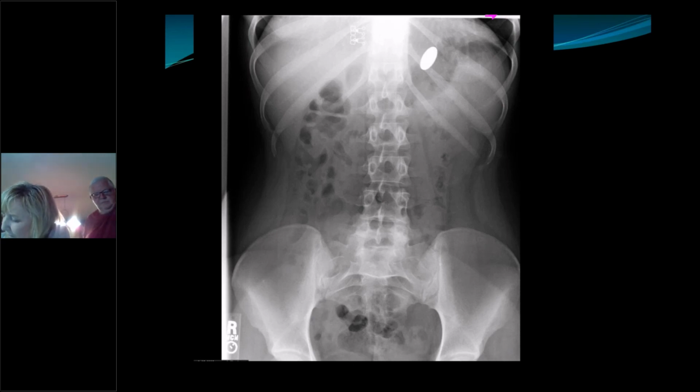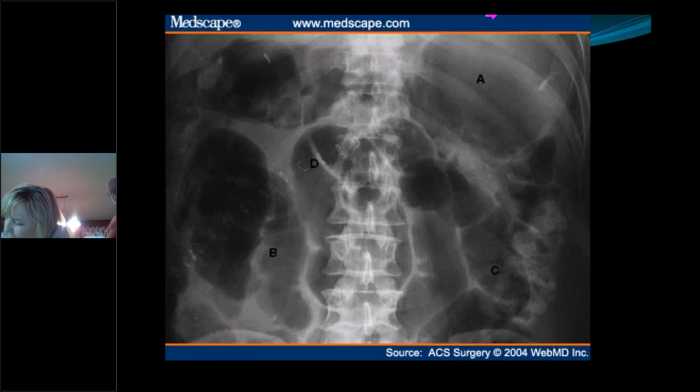This certainly is different if this person had swallowed magnets or things that may perforate the colon, sharp pins or pointed objects. That's a whole different story. But on things that are nice, round, and non-caustic, typically you can let it run its course and life is good. So looking at this picture, we see these haustras.